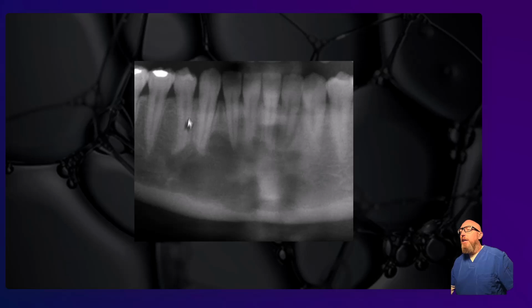Well, let's look at the age of the patient. Can you appreciate this is a fairly young patient? Not very old. They still have nice, strong cusps, just a couple of restorations, not a lot of periodontal disease. Somewhat young, probably younger than middle-aged. And so what fits that description? Maybe CGCG, myxoma, and the average is around the 20s. I don't see a lot of signs of myxoma. Let's get back to CGCG. What about location? Yeah, that fits too. So we're getting a lot of green lights with CGCG, and this turned out to be a CGCG.